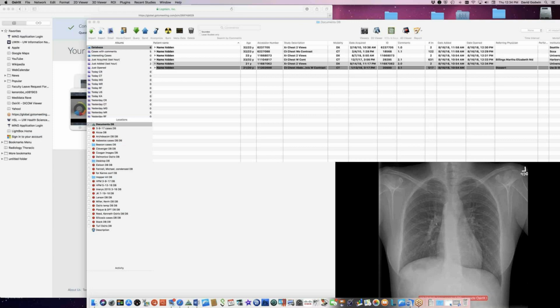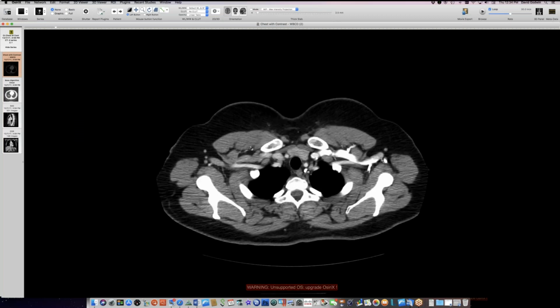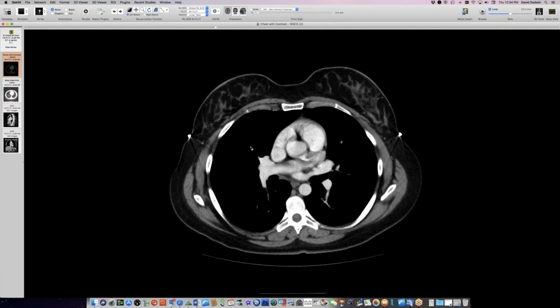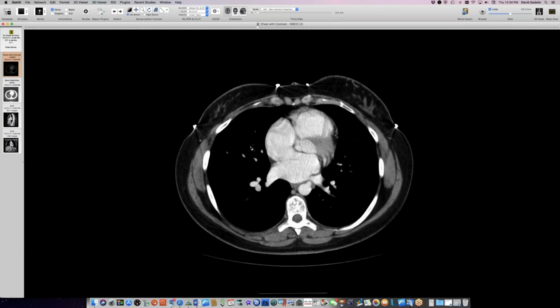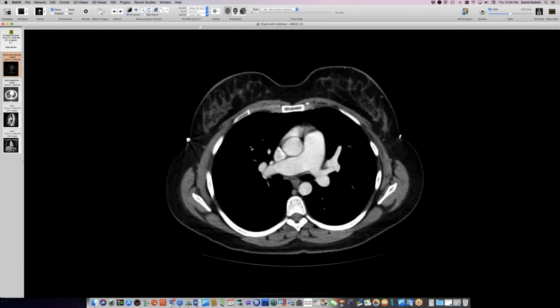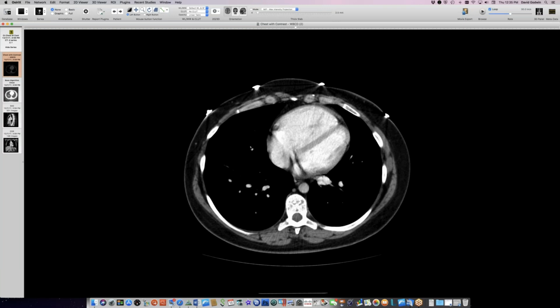Can you go back to the soft tissue windows on the axials, like the level of the atria? Because it almost looked like there was a sinus venosus ASD, but it may have just been motion, because I was kind of attuned to what Howard had been saying about the vascularity. No, I think it's just motion. Okay. I don't just go to the coronary sinus. It looked maybe a little bit. Was the coronary sinus dilated, or something unusual about coronary sinus?